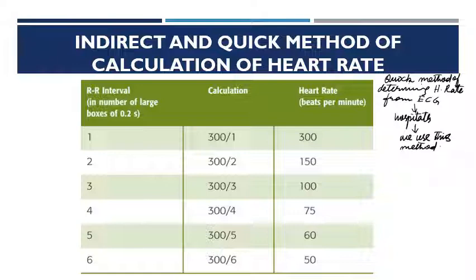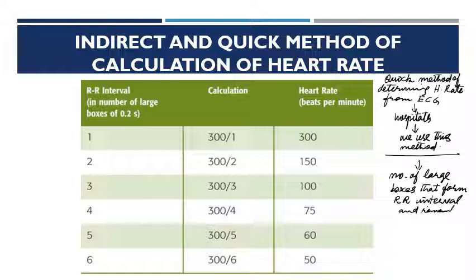For determination of heart rate by this method, measure the number of large boxes that form RR interval and remember this series given in this table.